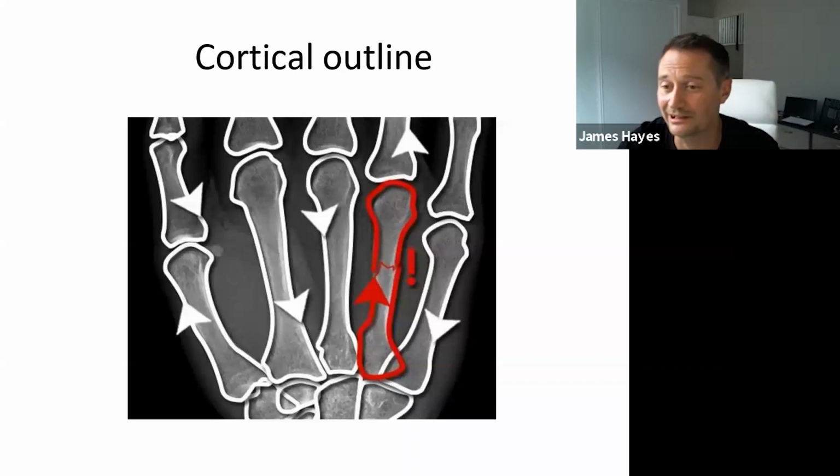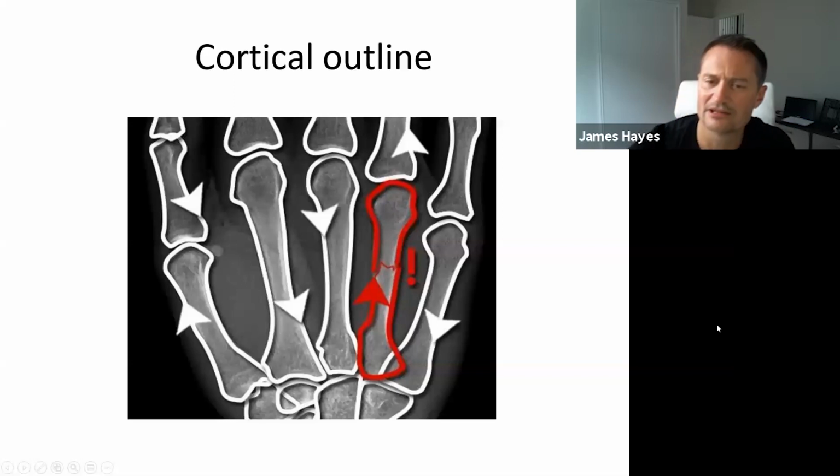But then you say, oh, well, actually, this sort of injury would come from having punched a wall. And this isn't uncommon. And so you suddenly get to one of the bones and there's a crack seen in the cortical outline, and then you kind of go, all right. Now, if you wanted to go on further and you had it without the red line, you could see the trabecular pattern cracked in there. And there's probably some soft tissue swelling around here as well. So there's all the radiology signs visible there.